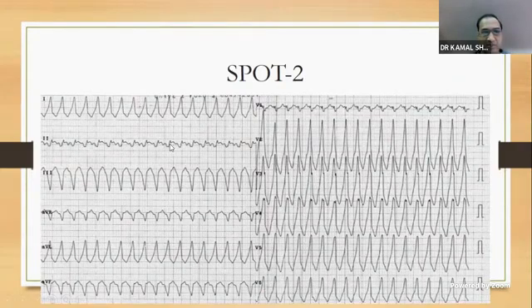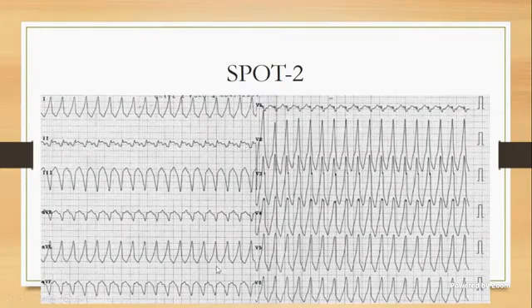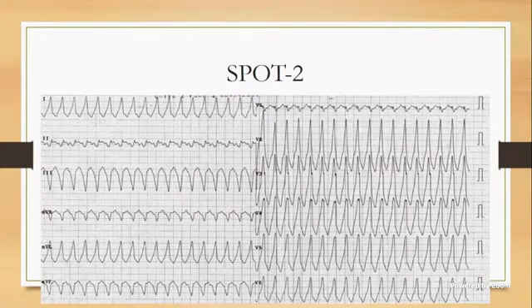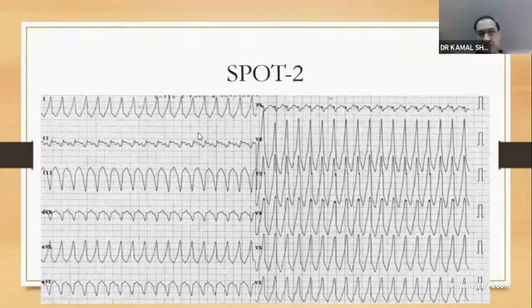Yes, sir. Lead 2, it is, sir. Yes. And even in AVF you can see. So this is most pathognomonic, right? You have concordance, you have axis. But the most important thing that can distinguish a VT from an SVT with aberrancy is AV dissociation. If you can find AV dissociation, fusion beat, capture beat, then you've done it. These are the most pathognomonic features because fusion and capture would never happen with an SVT with aberrancy, right?